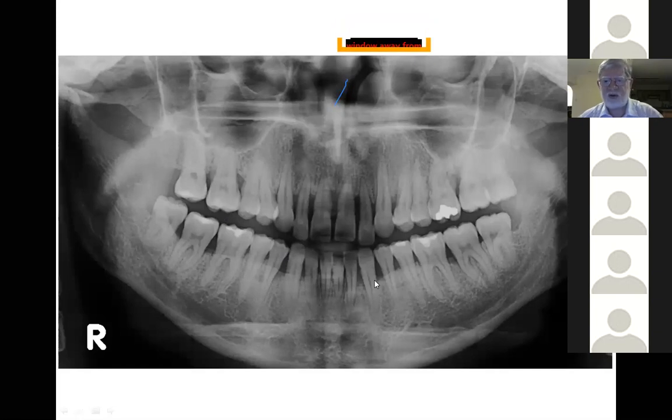I don't know if you guys come across the term, or whether the terminology has changed nowadays, called juvenile periodontosis. Have you come across that, where traditionally it affects the first molars and the upper incisors more than other teeth? This is pretty much an across the board horizontal bone loss, but there's more vertical bone loss there, quite bad bone loss there. And this is almost bordering on that sort of thing, but yeah, quite a severe perio here.